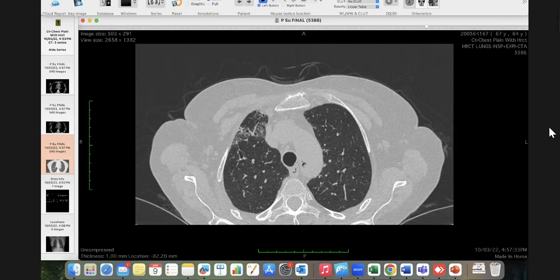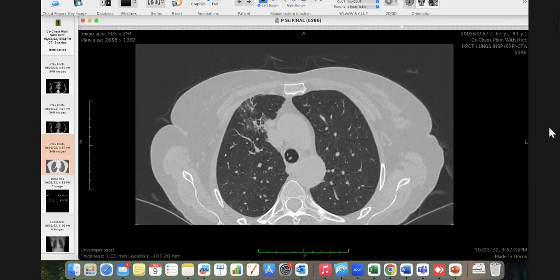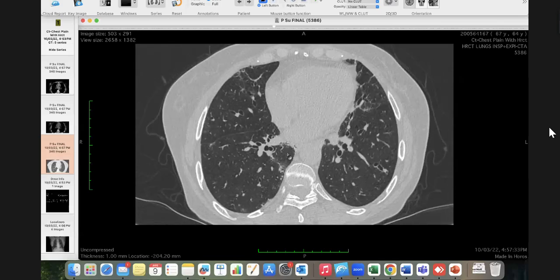It is my duty to look for a cause. If there is, I can find out any underlying disease. I can then correctly classify whether it is IPF or it is because of something else. And it has got prognostic significance because the line of management changes. So that is important. So exuberant honeycombing is also a sign of CTD ILD.